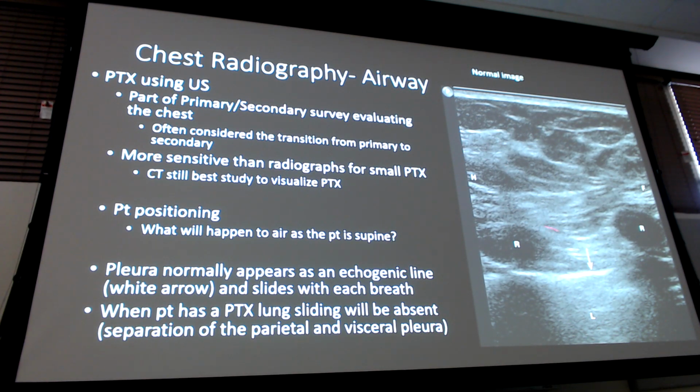And this is just showing you some anatomy here. We got the 2 ribs, or the dark area. Ribs are always shadowy. Ultrasound doesn't like ribs. Okay. I got my pleural line here. Okay. This picture, don't hang yourself up on memorizing this picture. This is not going to be the diagnostic picture. I'm just giving you an anatomy lesson in that aspect, okay? So we got ribs, we got pleura, and L is probably what?